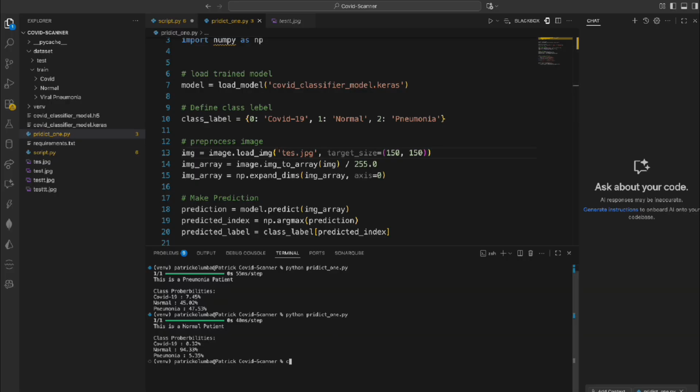So let's see what it's going to predict for this particular unseen image, never seen this image before. So let's see, we picked it up as a COVID patient image. See, this is a random image from the internet, and it's saying that this is a COVID patient with a probability of 99.9. That's almost 100. This is powerful. This is amazing.